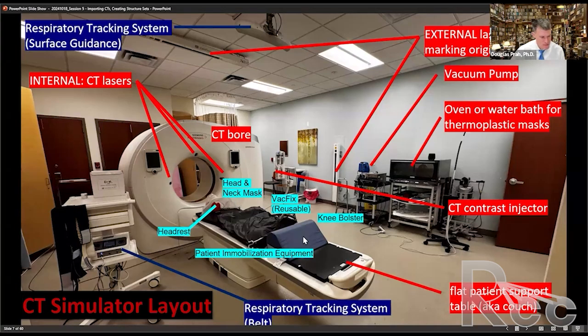I put some other equipment on the table just to give everyone an idea of what we use for simulation. Often for head and neck patients, we'll have a head and neck mask with a headrest. If it's in the abdomen area or the pelvis, you'll definitely see us using these vac fixes. We find that knee bolsters are very helpful, especially to minimize the gap in the lumbar spine region to the table, and it provides patient comfort. So this is in general an overview of the room.